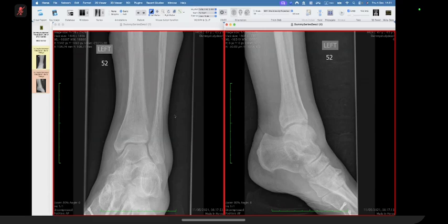I also want to check the joint surface is seen intact. The tibia and the fibula and tibiotalar joints are seen intact. There are changes seen in the cortex and the medulla of the fibula, distal end of the fibula. It's perfectly fine. Mild osteopenia, not Paget's, nothing to worry about.